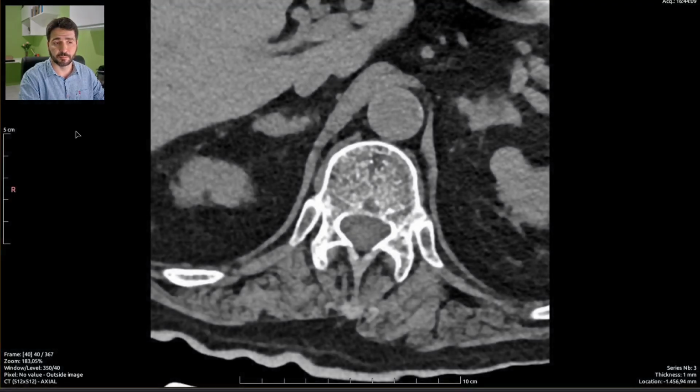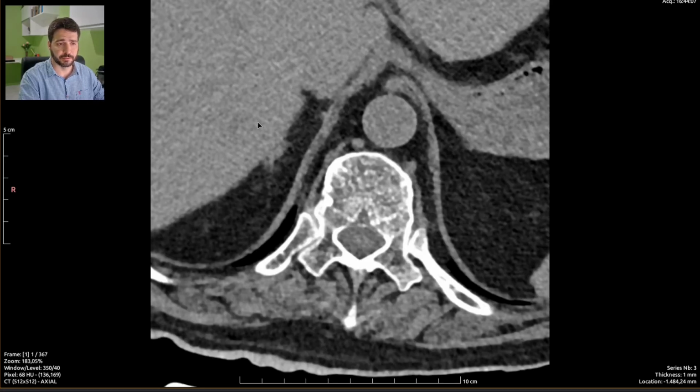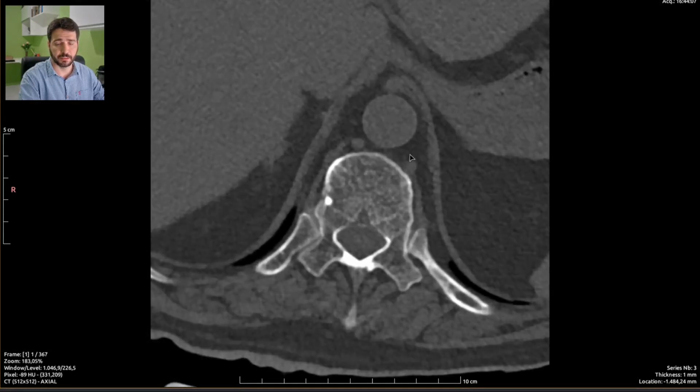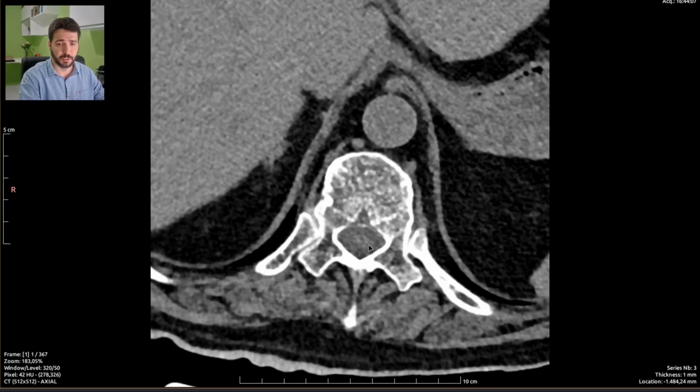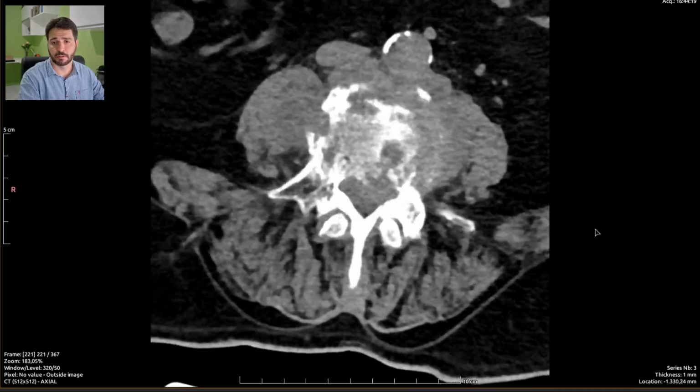The download is done. Let's load up the images. We have both a soft tissue and a bone recon. I'd rather just use the soft tissue recon because I can see enough bone and neural structures and muscle and all this stuff just by looking at this recon.